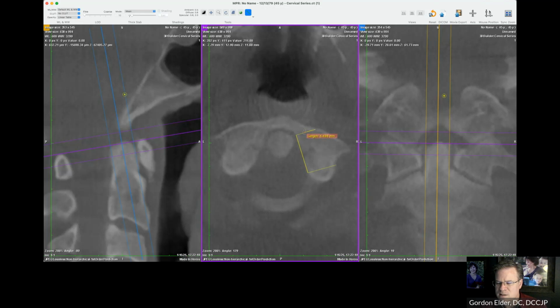And you'll notice that my line stops just a little bit to the side of that line, and that's just so that I can see it later. If it was right on top, it gets hard to see when the two lines are right on top of each other. Same thing here. Let's do this one. 12, so about 6 millimeters is about halfway. Okay, so I bisected those two lines. Now we're going to draw a line in between.